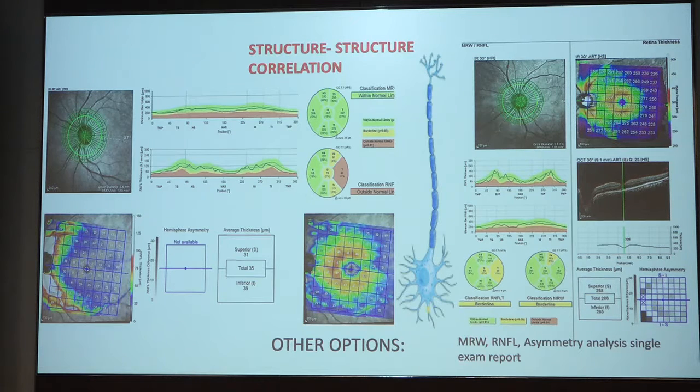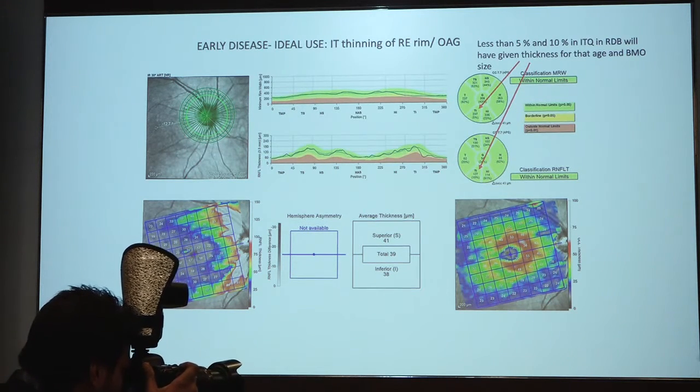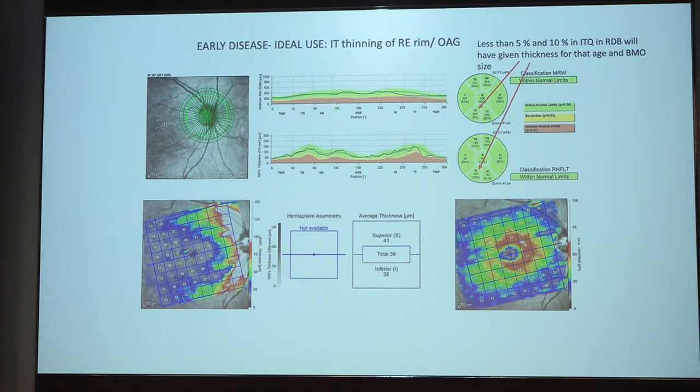Now let's see how it applies clinically. This is what Dr. Satyan was telling about the statistical parameters. See, you did the OCT because you suspected something, not because you have a machine. That's what I presume. So when you suspected something, look at the area which you suspected rather than looking at the values the machine is giving you.